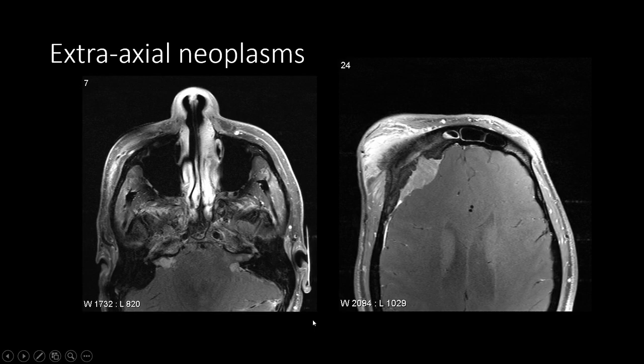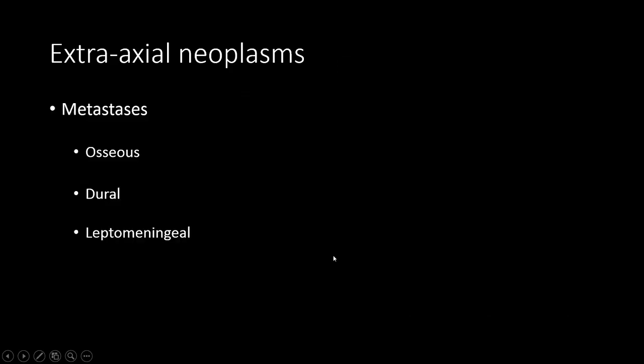So this is a patient with NF2. We see on the post-contrast T1-weighted imaging bilateral vestibular schwannomas. These are images through the internal auditory canals, as well as a large right frontal intraosseous meningioma. Okay, so NF2: schwannomas, meningiomas, and ependymomas.